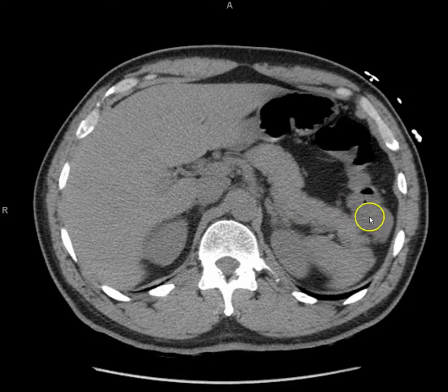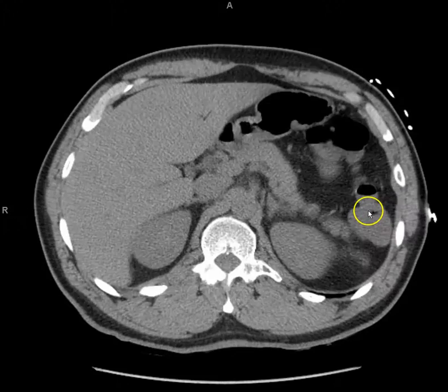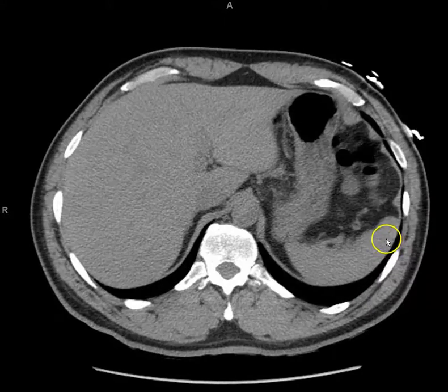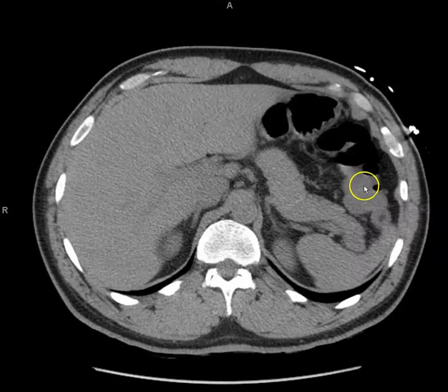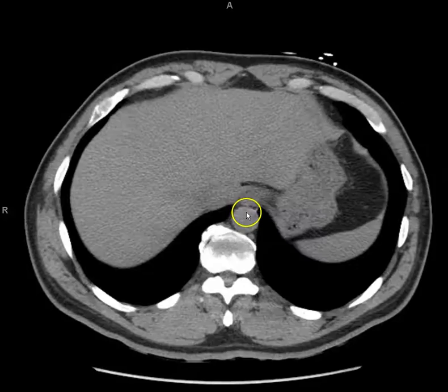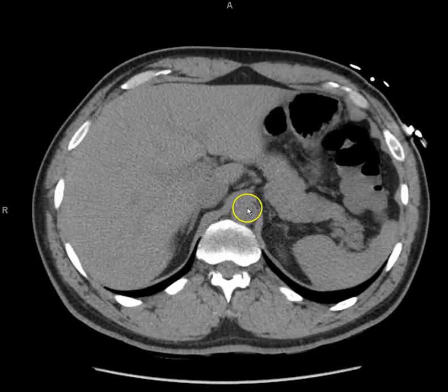Right. What is this organ here? No, this is the spleen. This is the thing I'm talking about. Not small. Large. This is the splenic flexure. So what? Splenic flexure of the colon. Excellent. Good. Right? Spleen. Stuck together. So let's go back. Let's go back up.